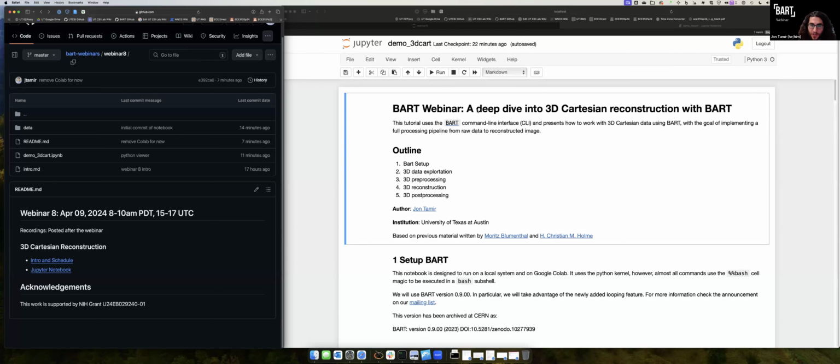So the goal of this webinar is to give you a sense of what I would do if I were given 3D data and I need to reconstruct it. I have some sense of what the data represents, but I still need to understand it well. And because it's 3D, there's some visualization that needs to happen.